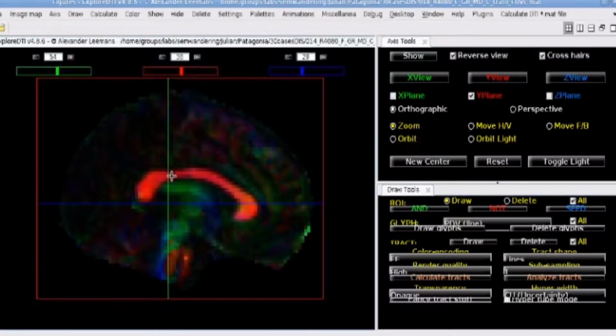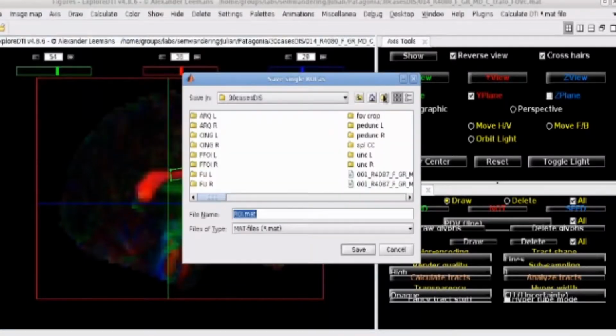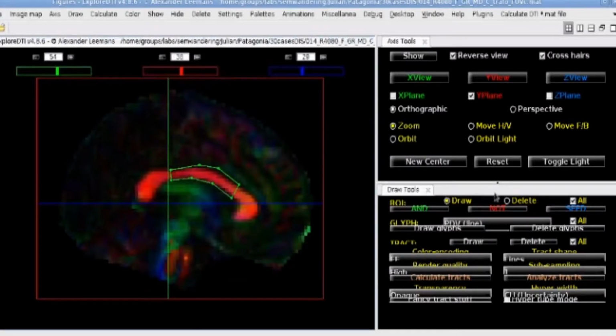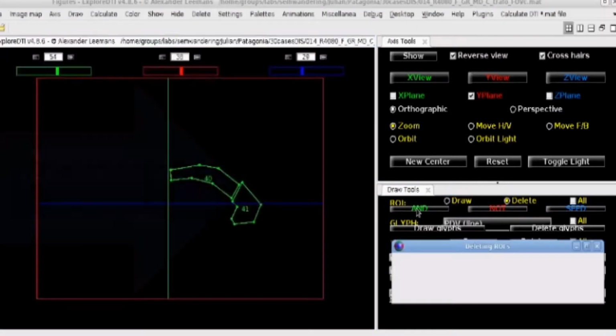Perhaps it's a low value, but the images are very nice, with the consequence of the ghosting artifact that is an acquisition artifact. The echoplanar imaging acquisition causes the fat to create a ring between the occipital and parietal lobe, so it increases the fractional anisotropy, but this is an artifact.